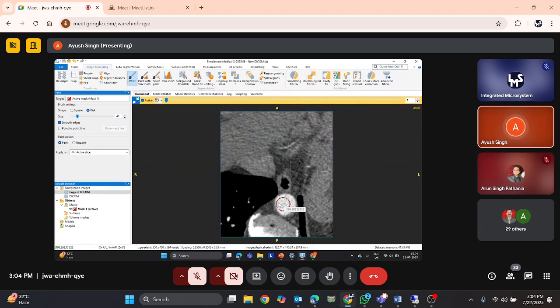So we can navigate between the slices from our mouse itself. We need to mark the region in every view where we can see the particular part. Any user will get frustrated using this process and might think that it's a very lengthy and cumbersome process.